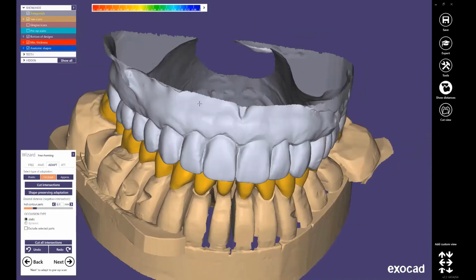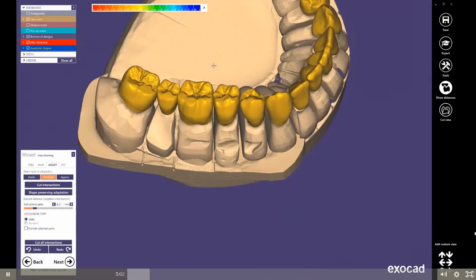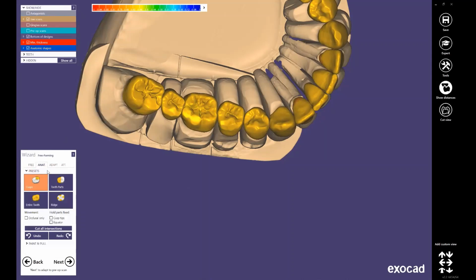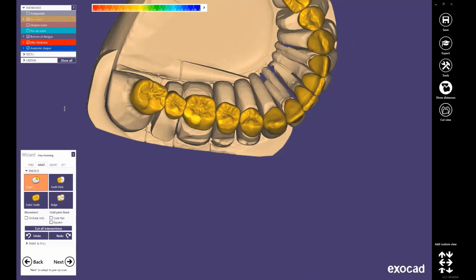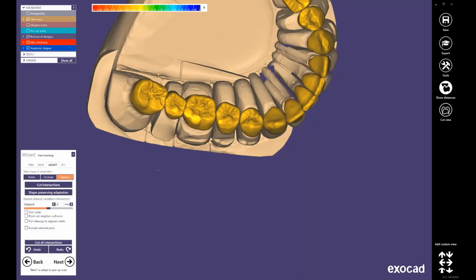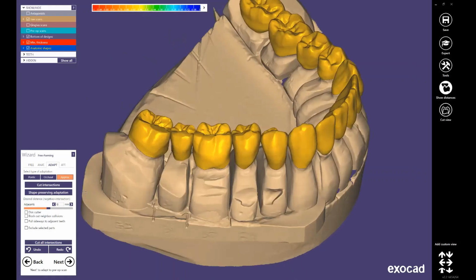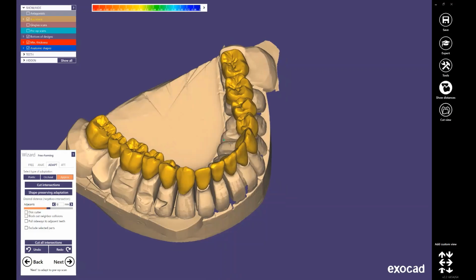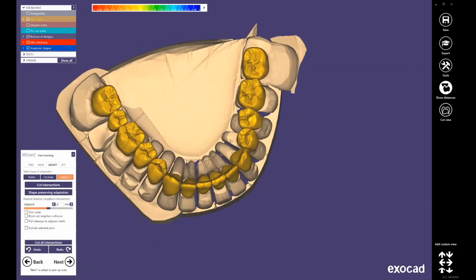So again, this step is pretty easy. You just do freeform, right? I already explained to you how to do your freeform. Here you have different tools. You have anatomic, right? You can stretch your tooth. You can do tooth part and then adapt other things. Approximal, so interproximally we want to just adapt. So in the distal and mesial side, now we don't have contact. And so everything looks ready to go. So next step.